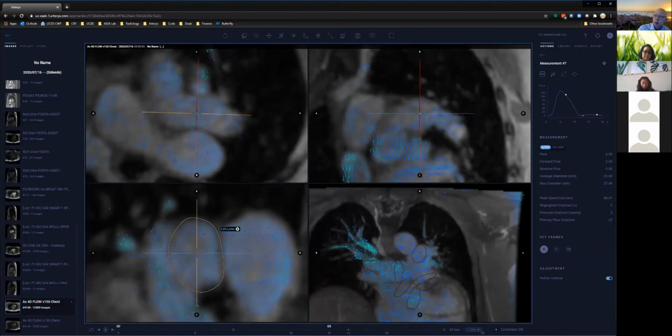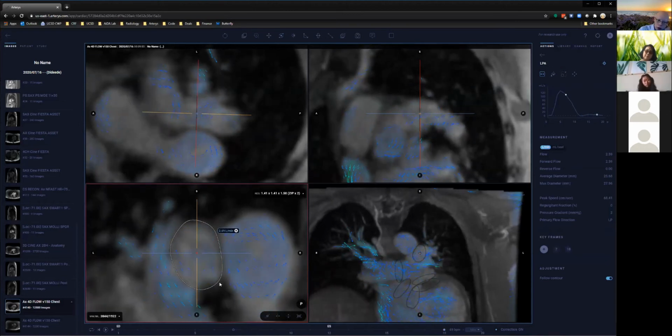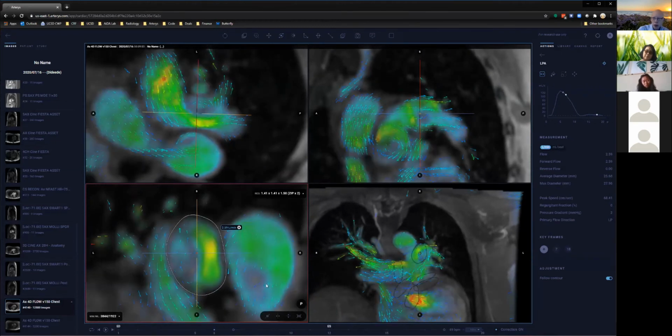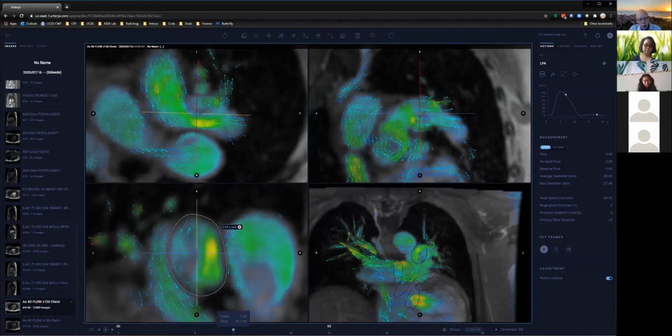The other thing that you might notice is that with this, I'm only doing maybe one or two segmentations. I'm not spending a lot of time doing every single branch pulmonary artery, or every single phase of the cardiac cycle. One of the things that I implemented when I wrote the software the first time was to incorporate that interpolation aspect, so that in between the cardiac phases that you annotate, that you mark up, the software automatically fills in the phases in between.